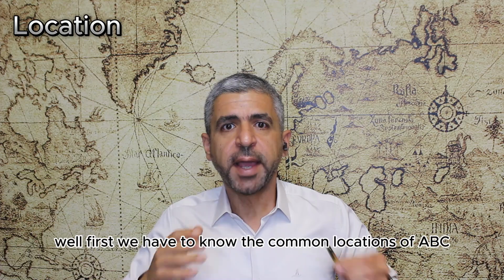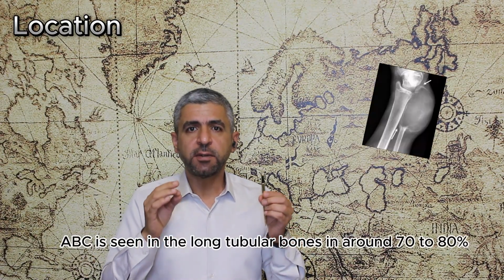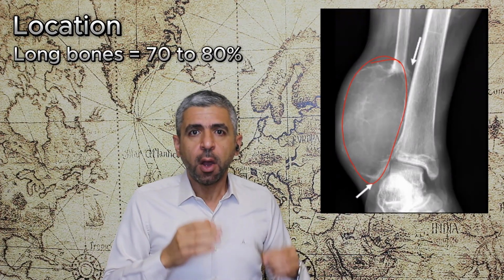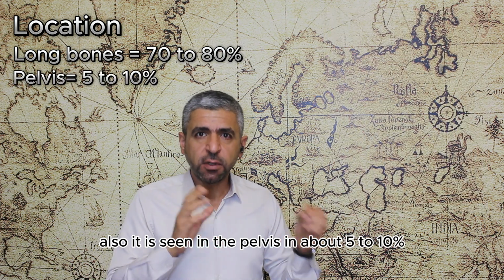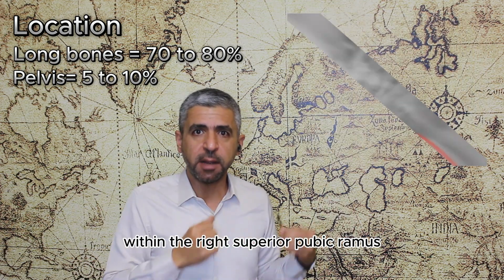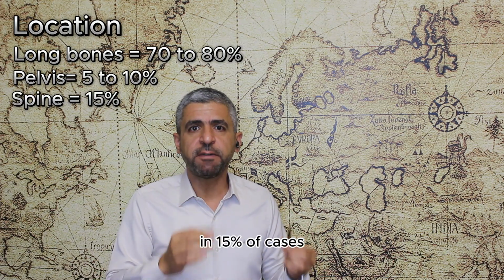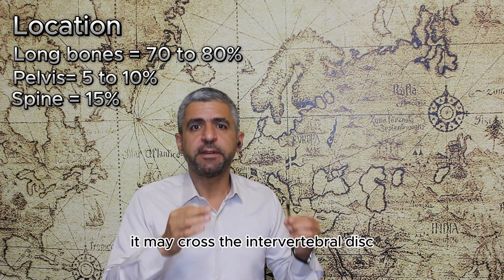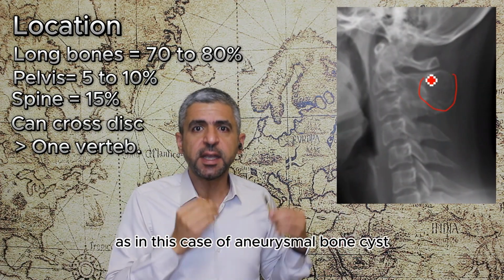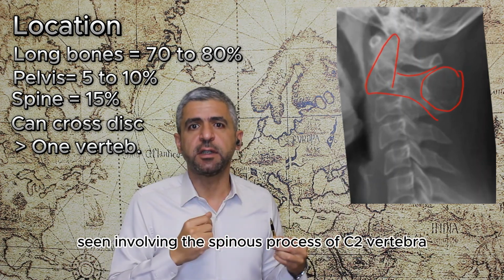Well, first we have to know the common locations of ABC. ABC is seen in the long tubular bones in around 70 to 80%, like in this example of ABC within the fibula. Also, it is seen in the pelvis in about 5 to 10%, as in this case of ABC within the right superior pubic ramus. Also, it is seen in the posterior elements of the spine in 15% of cases. It may cross the intervertebral disc and can involve more than one vertebra, as in this case of aneurysmal bone cyst seen involving the spinous process of C2 vertebra.